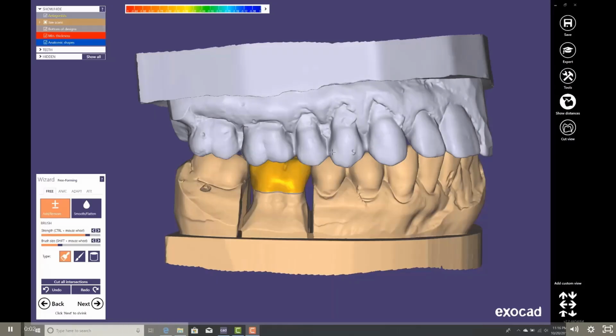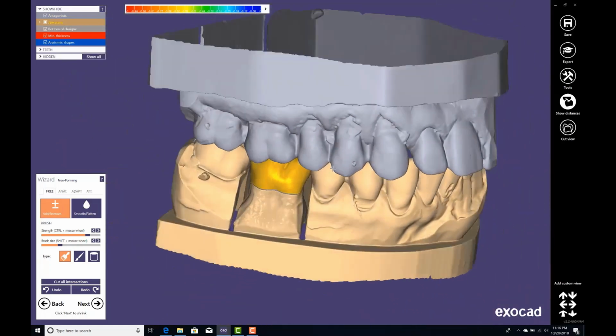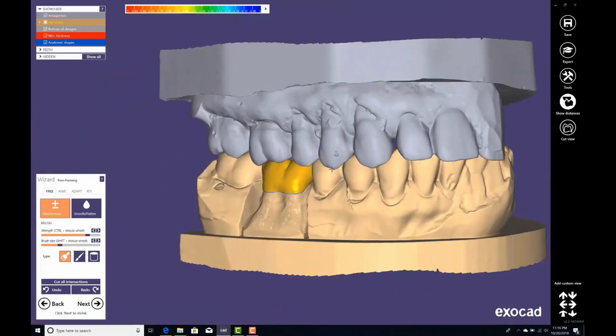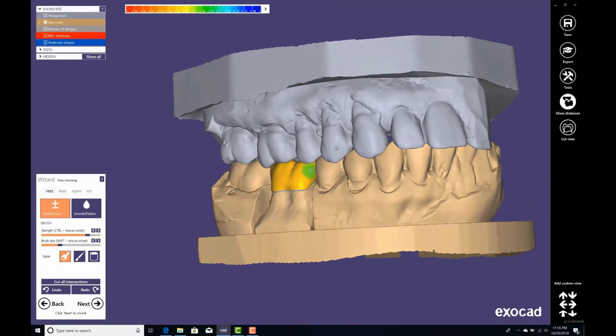So let's talk about hotkeys. First of all, I want to tell you how you can move the mesh. By clicking the right button of the mouse and moving it, as you can see, you can completely rotate your meshes 360 degrees on the screen. This is pretty easy.